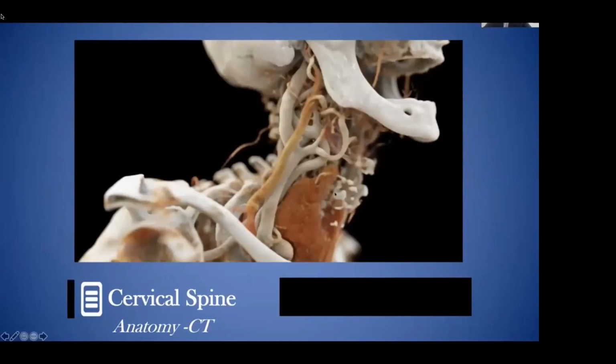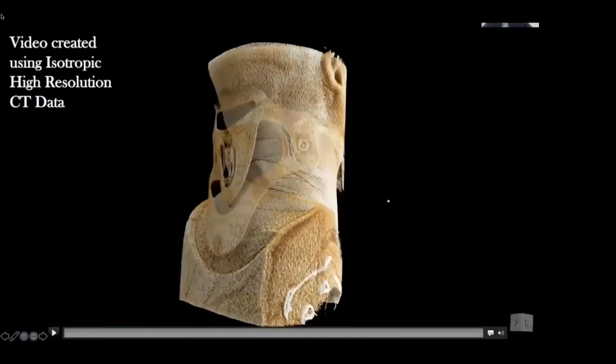So again, cinematic rendering, I think, is particularly useful for understanding anatomy. I think we're moving progressively towards an era where we're able to visualize things reliably in 3 dimensions with exceptional granularity. And we're also able to see with relative perspective where various structures lie adjacent to one another in terms of depth and position.